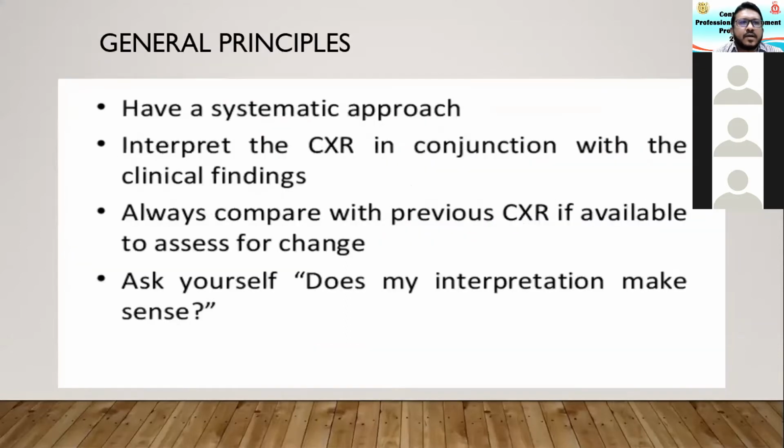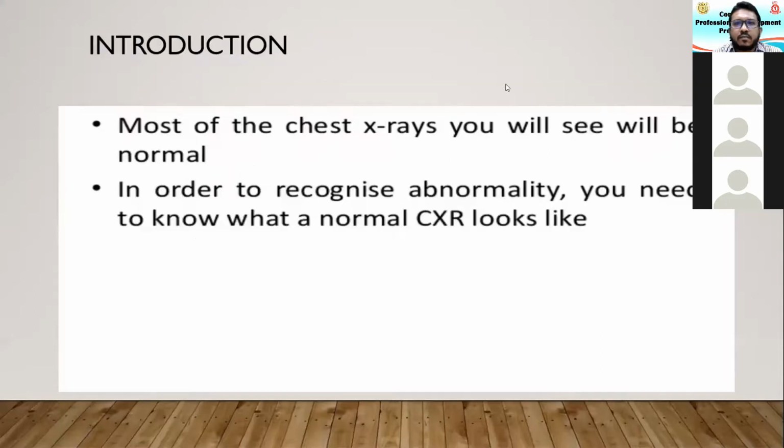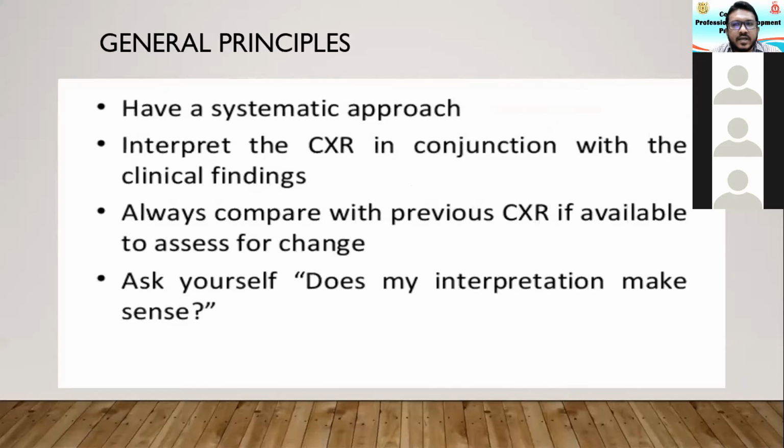As a general principle, you need to have a systematic approach to tackle an X-ray. Though it looks very simple on appearance, it's very difficult sometimes to interpret any subtle changes. So interpret a chest X-ray always in conjunction with the clinical findings. If you are lucky, you can compare with a previous chest X-ray if available, and make sure that your interpretation makes sense as a clinical diagnosis.